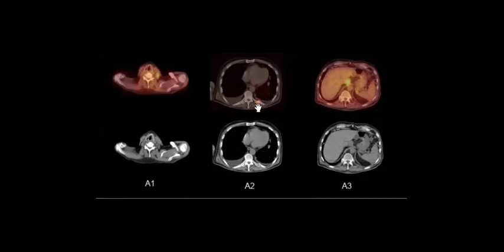This is maybe one of the sites where it can be a pathological fracture. Yes. So multiple cervical lymphadenopathy, osseous, and you get something in the liver, so it is also involving the liver.